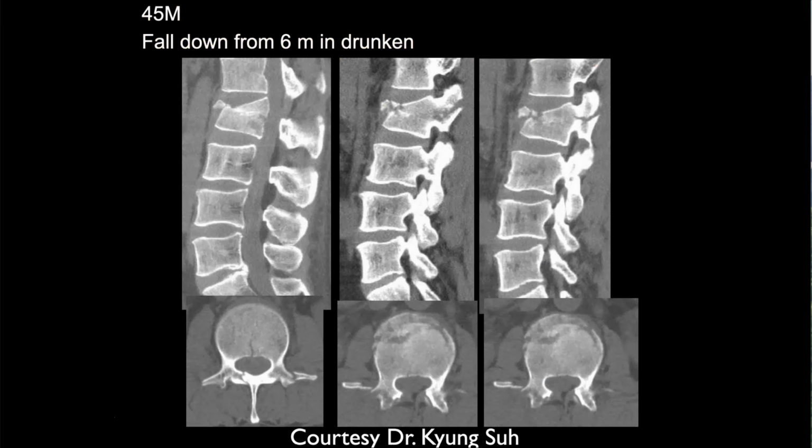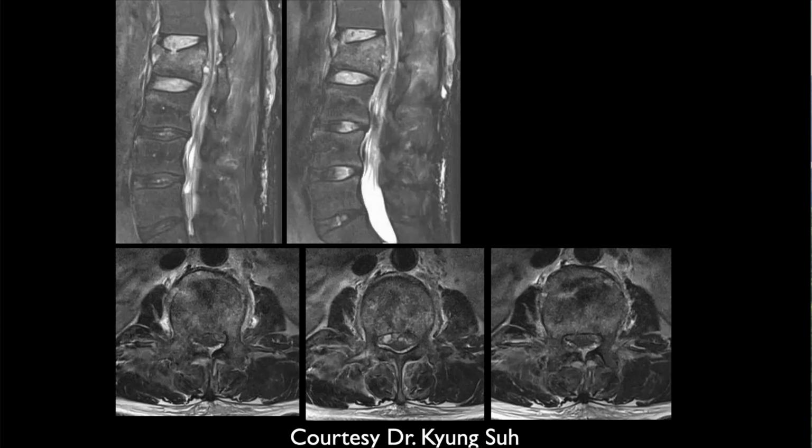So it looks like we have a fracture at the vertebral body and extends to the posterior elements. Yeah. That doesn't look stable to me. Definitely not. So again, we're dealing with a burst type fracture which extends into the posterior elements. So I agree with John. It doesn't look stable to me either. And then here's what the MR scan looked like. And I'd be very worried about the neural elements right through here too. Okay.